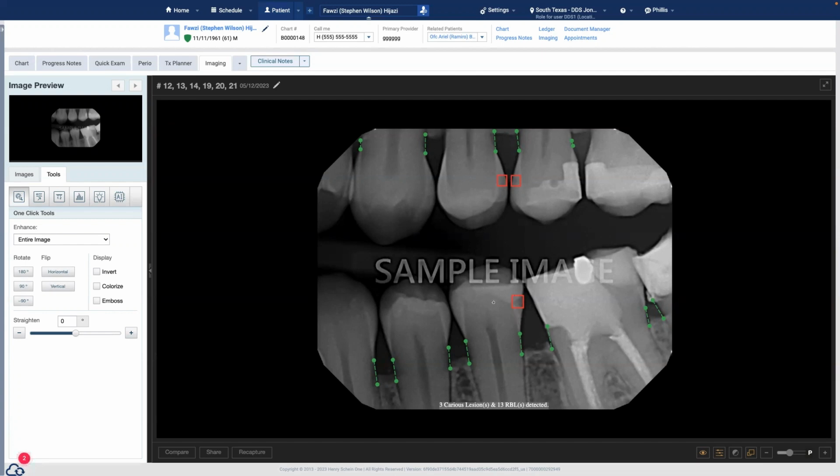So some of the things are going to be, oh, that was an overhang. Yeah, I think we're good there. So it's not that the AI is broken. That's some feedback that I've heard. It's about the fact that the AI is looking for what we call anomalies.